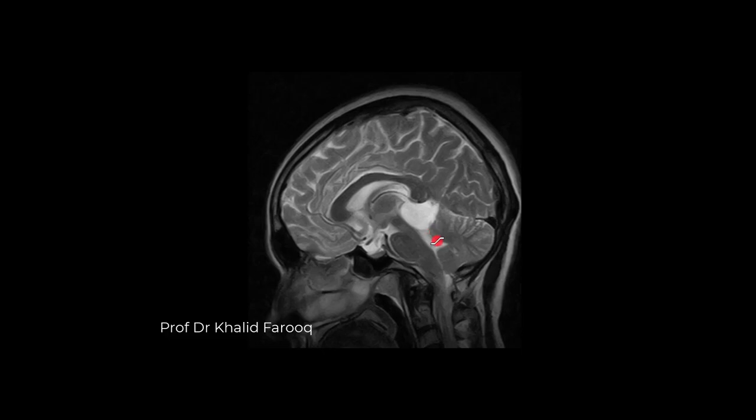On this image we see and give differential of pineal gland cyst or cyst of the pineal gland versus arachnoid cyst of the quadrigeminal cistern.